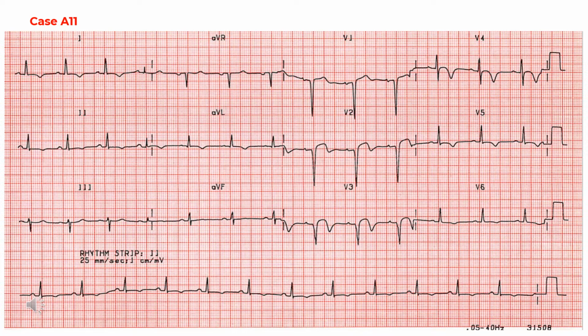The ST segments show the raised appearance typical of acute myocardial infarction in leads V2 and V3, and the T waves are becoming inverted in these leads at this stage. Established T wave inversion is present in leads I to AVL and precordial leads V4, V5, and V6.